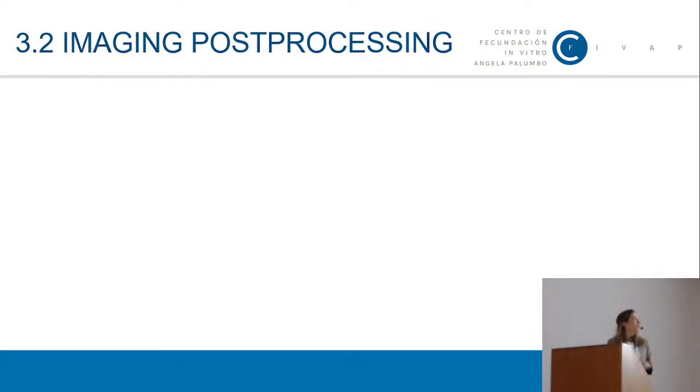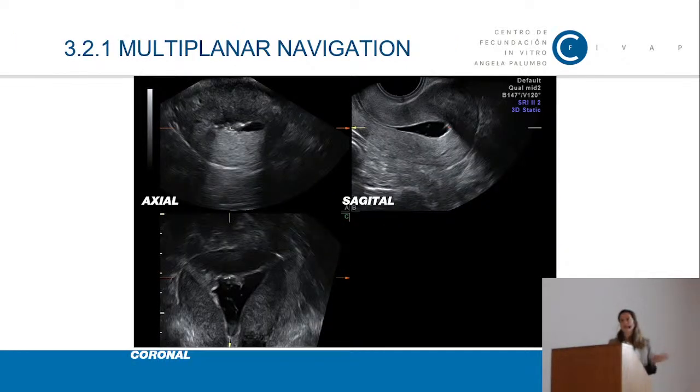The post-processing, first of all, I will do a quick review of how to navigate in the multiplanar view. And now I will check if you understood, Peter. To do so, we are going to start with the coronal view of the uterus, and then I will rotate it in different planes.